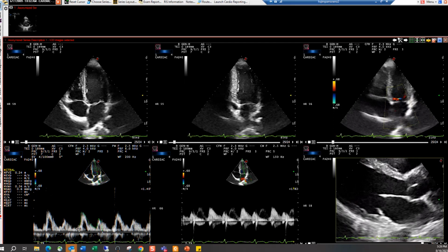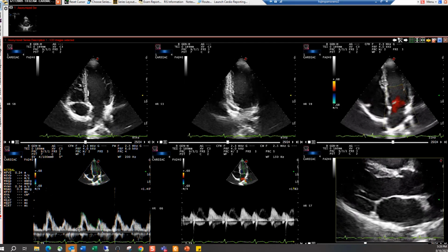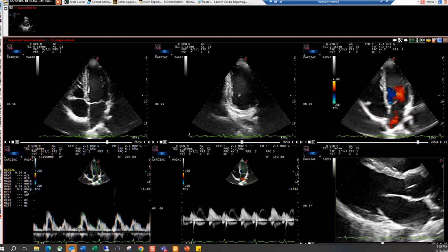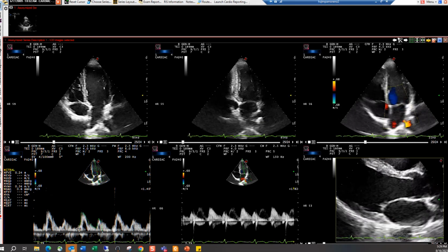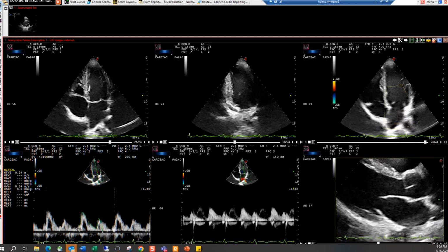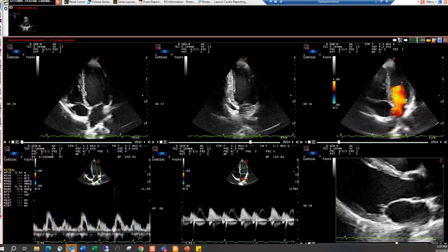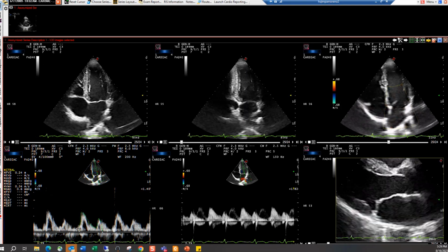If the sonographer is the one writing the preliminary report, the sonographer would do the same thing. They would go in, launch cardio reporting, and check that the measurements are all there. They would put in their abnormals, and at that point put it into preliminary status. Putting it into that preliminary status then allows the cardiologist to see it in Encapture, and it's ready for them.